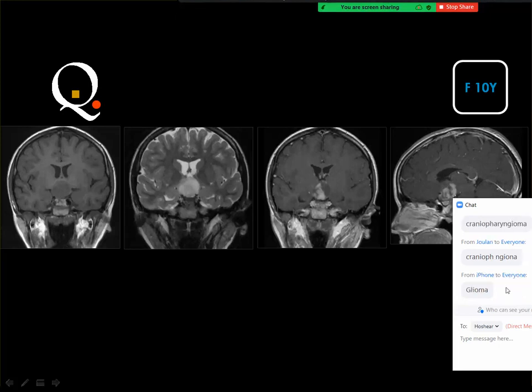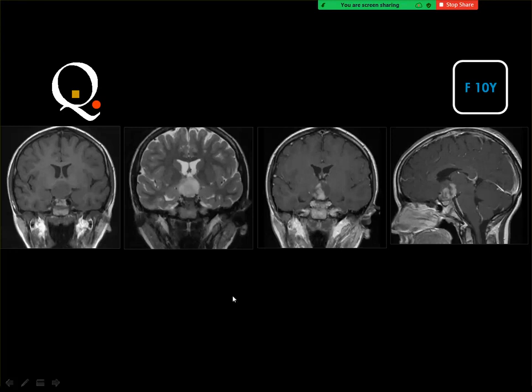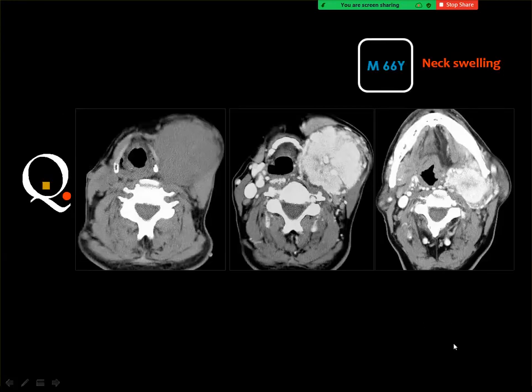This is a hypothalamic glioma. Yes, this is hypothalamic glioma. You got a solid lesion and there is no cystic component. Look at the CSF, and this is a solid component. If you inject contrast material, this is not a cystic component because it shows enhancement, as seen in the sagittal image, a homogeneously or heterogeneously enhanced mass in the suprasellar area. In a child, you should think of hypothalamic glioma.